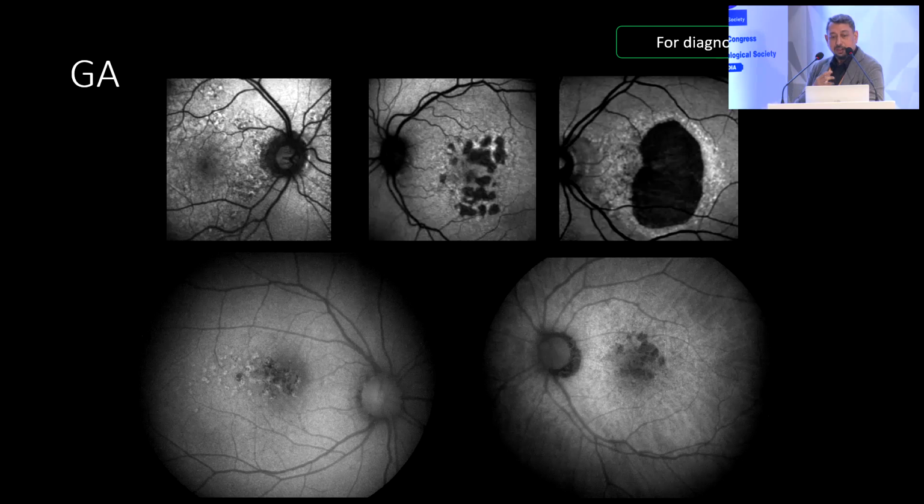And how do you know that? We use it for geographic atrophy progression, diagnosis, and progression over years. There are many things to look at, including the hyperautofluorescence areas, the progression, the shape, the edge of the autofluorescent black. So if you have a curved, round, circular edge, it means it's less advancing. If you have a scalloped edge, it means it's a faster advancing edge. So the use of autofluorescence.